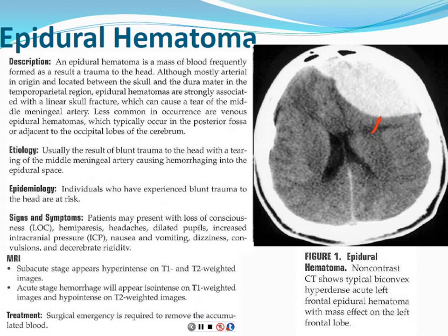As soon as you see this, the patient needs to be taken to the OR to decompress it. And if you get the patient evaluated and a CT really quickly, take them right to the OR, they'll usually do okay. But we're imaging a lot of trauma patients now, imaging the head pretty readily and trying to look out for really major things like this.